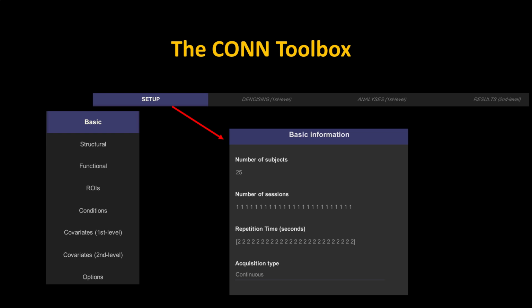And then within that, you actually set the numbers and everything. And then, you get all that done, you move on to the next one, denoising. You have some more options on the left, you run through those, and so on. So I really like the interface. It's very clean and very well laid out.